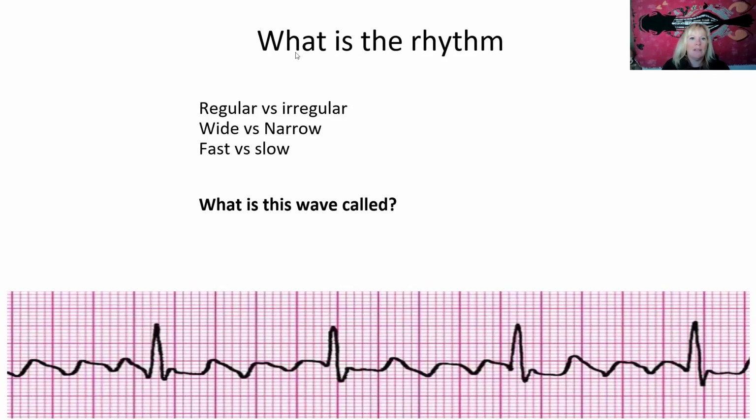So it's got a sawtooth pattern. Absolutely, you guys are spot on. Look over here. You've got the sawtooth. It looks like a fence, a picket fence. And these are not P waves. These are called F waves, also known as flutter.